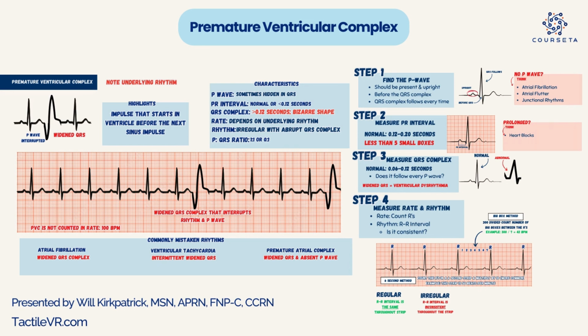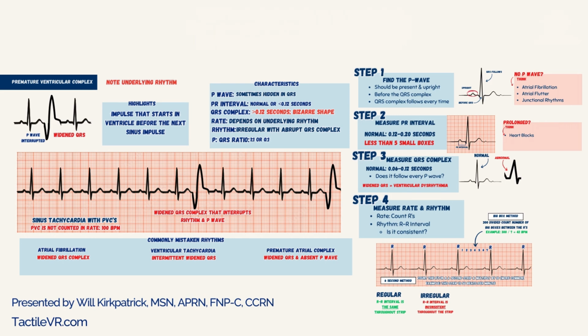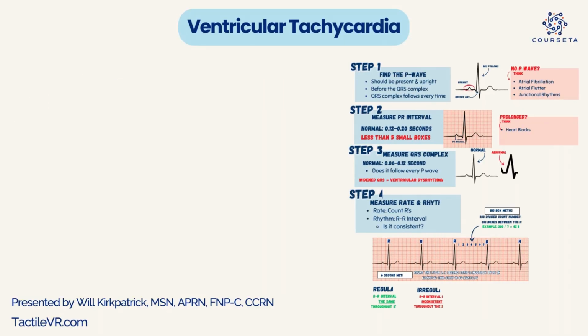All right, so you might see this in your EKG exams, that they're going to put the underlying rhythm in with your answer similar to this. This is sinus tachycardia with PVCs. So that would be your answer in this case. But really, guys, make sure you remember that and write it down, that you don't ever count the PVC or the widened QRS complex that spontaneously occurs as part of your rate.